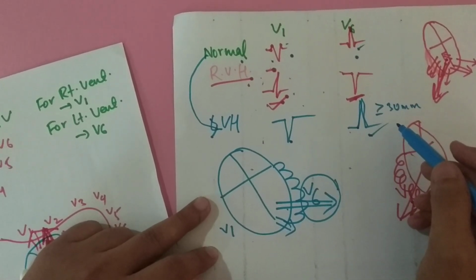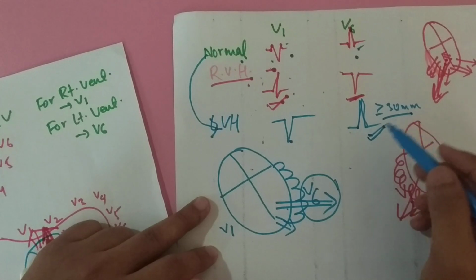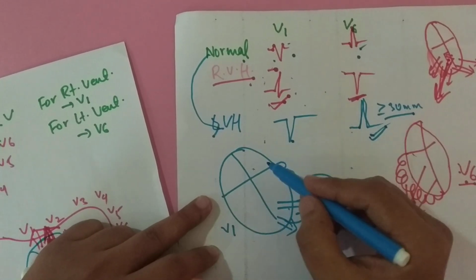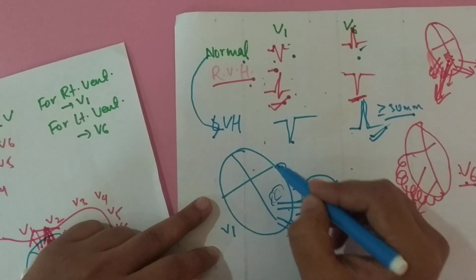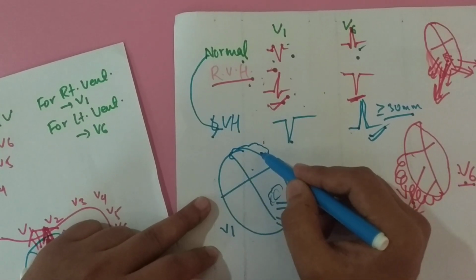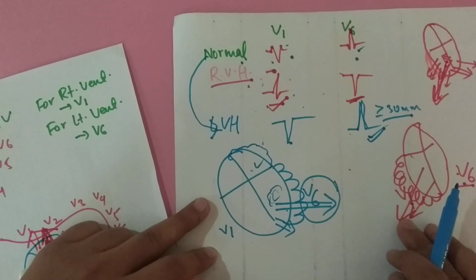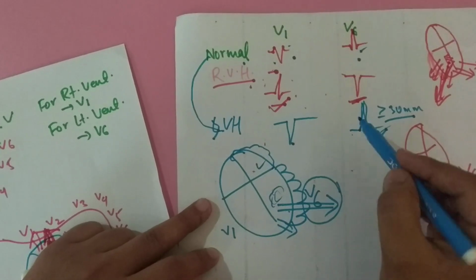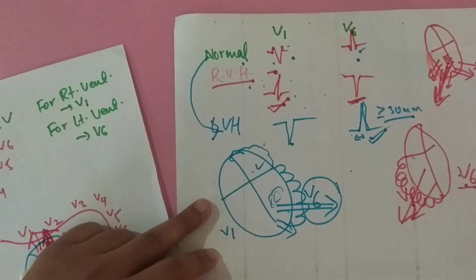Similarly, there may be other features. In left ventricular hypertrophy you will also have left atrial enlargement, because eventually there will be fluid overloading, so you can get left atrial enlargement features also. And there are different criteria, and another thing is that the intrinsicoid interval is also increased.